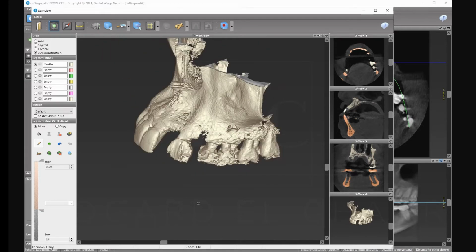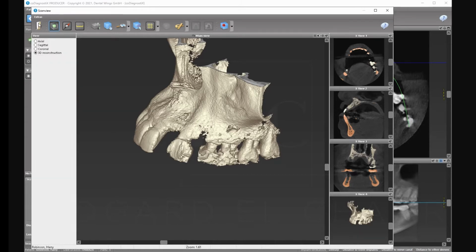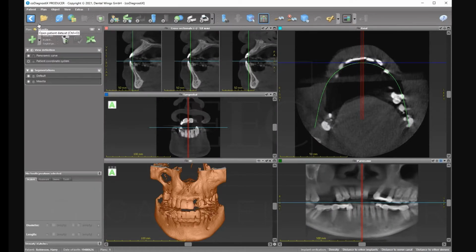Look, it doesn't help. So what you do is you just try to clean up to see some points that are in your way. See here, he has a space, so I cleaned it up because the scatter moved. So now I'm done. I press back home. It takes me back to the center. Now you say, where is it? I remove the default, and there you go.